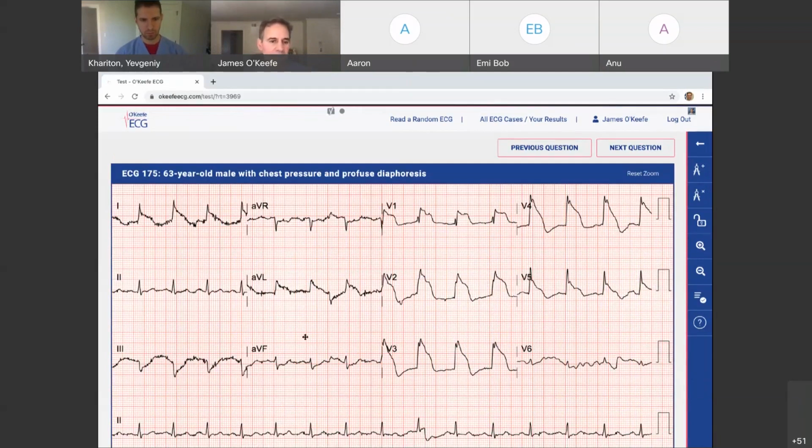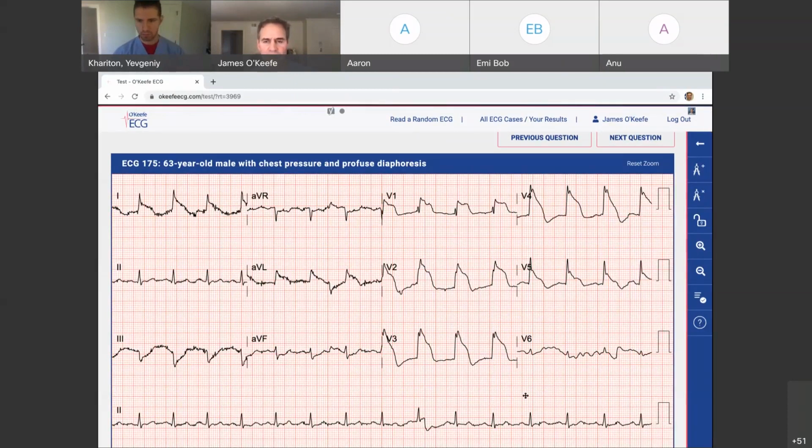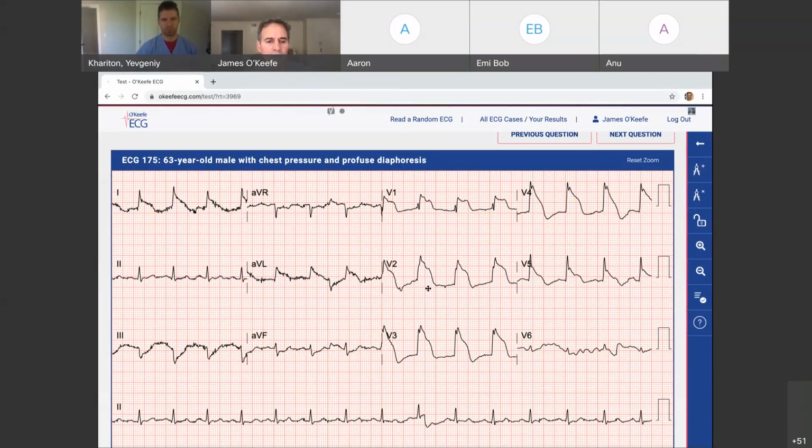This ST segment elevation, it is sinus tachycardia. I think it's like 17 QRSs across. I think it is anyway. But no, it's actually just under 100. So it's sinus rhythm. So it's very striking in V3 to V4.